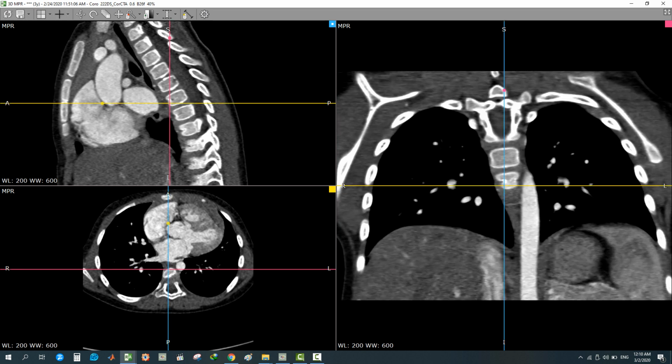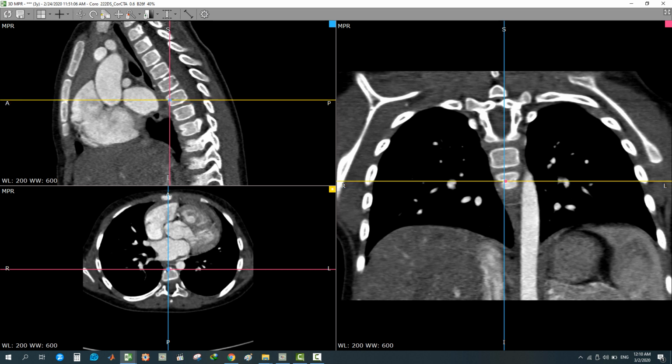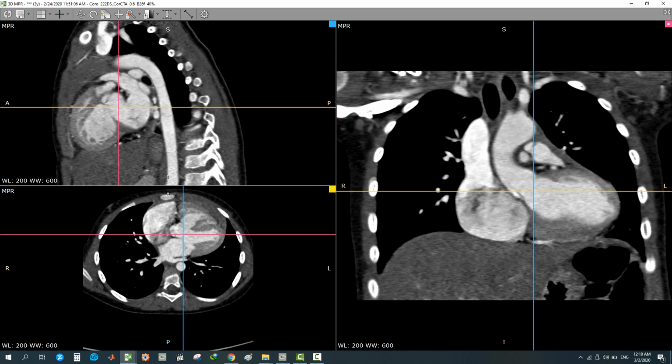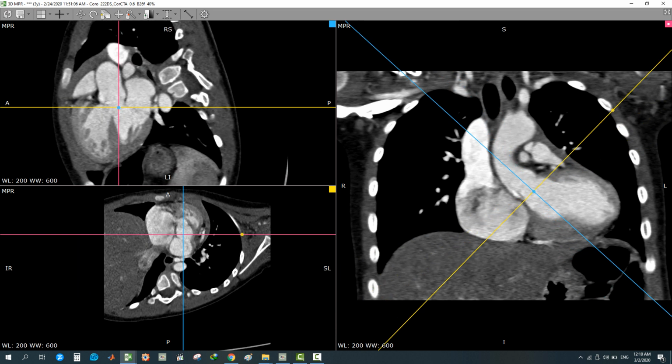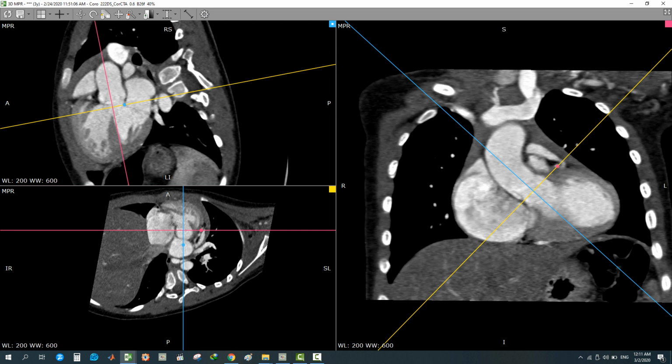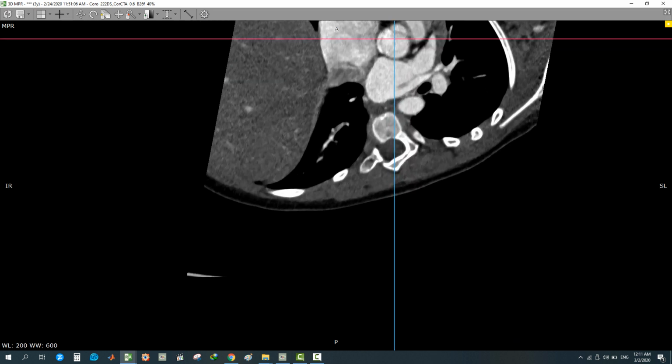Then you need to see or check the aortic valve for cuspidity and the root of the aorta in the coronal plane. Aortic root tilted to the right 45 degrees, so you will tilt your lines with the inclination or the obliquity of the aortic root in this plane, and anteriorly like this, from 15 to 30 degrees anteriorly. This is anterior, this is sternum. You will tilt again with the aortic root. You will get here the aortic valve cuspidity, as you see, this one.